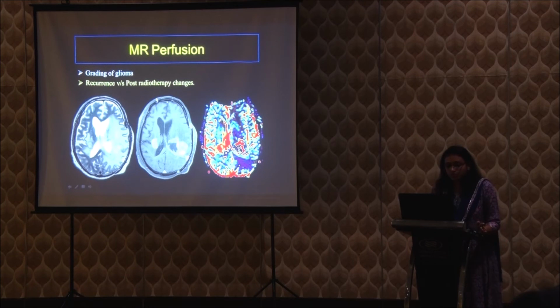Also, it is used in differentiating recurrence and post-radiotherapy changes. This was a patient where there was a recurrent lesion after operation, almost after 8 to 9 months, and this recurrent lesion was showing hyperperfusion in the right parietal lobe.